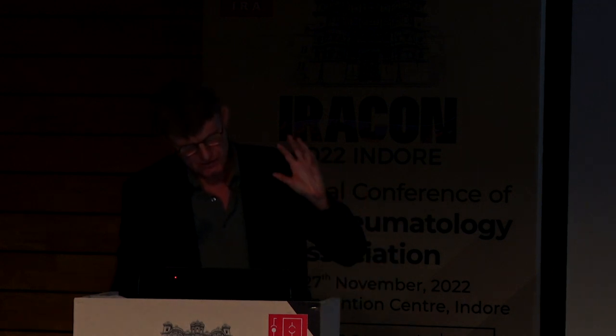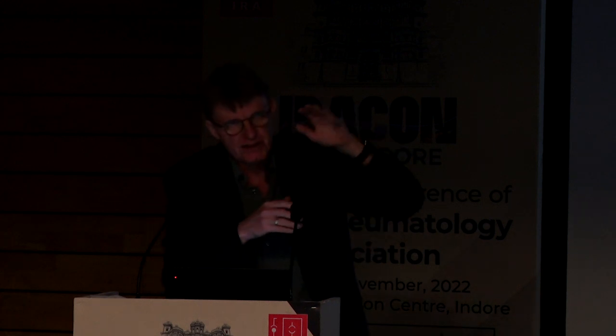And when you go through, you will continue looking for that. You can see that the joint space here looks normal, it's smooth, like rail tracks. On the other side, it's less smooth, but that's also normal. The joint space is curved in different directions, and therefore you won't always cut it perpendicularly, which gives sharp margins. You have to live with the fact that it's sometimes blurred. It's 4 mm, 6 slices, which covers a lot of things, but it still looks normal.